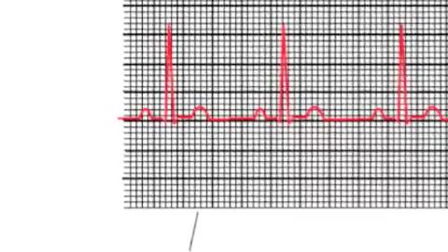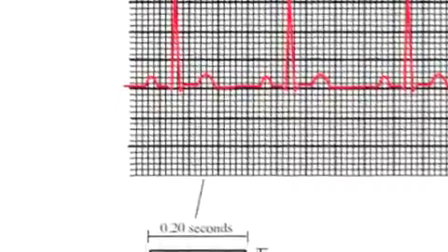The third one would be to be able to accurately measure the ventricular rate on a 6-second strip, or any strip for that matter, the PR interval, the QRS interval, and the QT interval. Interpret the rhythm strips based on their measurement findings, recognize lethal dysrhythmias, and then describe the nurse's role in the case of a lethal dysrhythmia that results in a resuscitation effort.